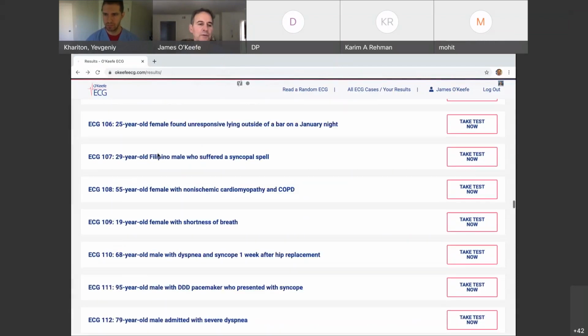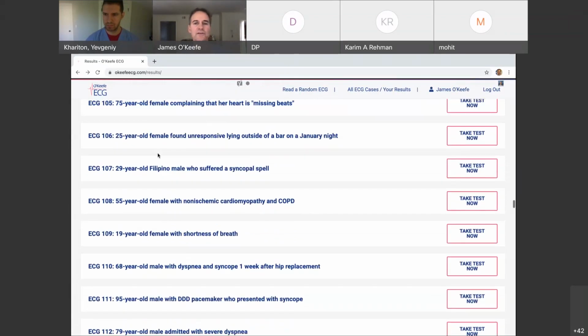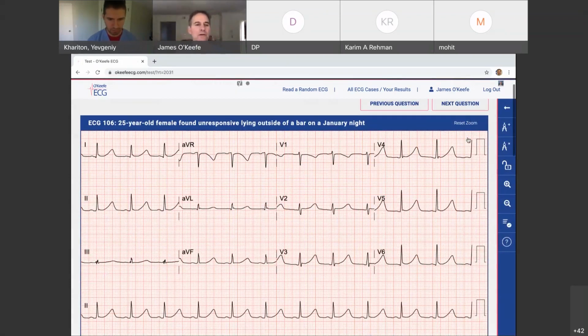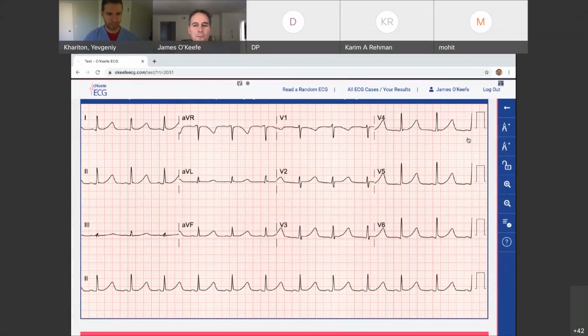Let's go way up here now. This one. Here's a 25-year-old female found unresponsive lying outside of a bar. It's actually up in Minnesota on a January night. Don't be shy. Anybody?